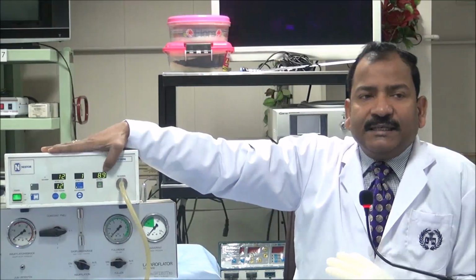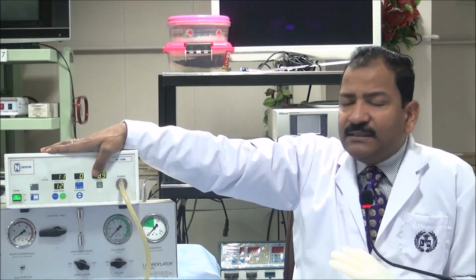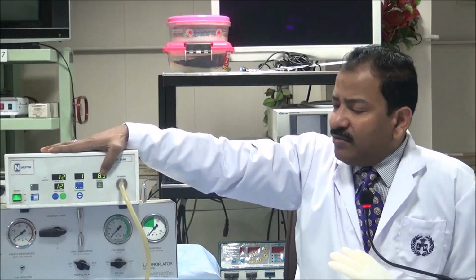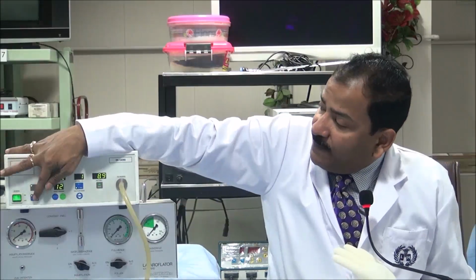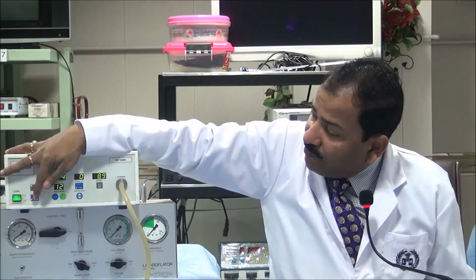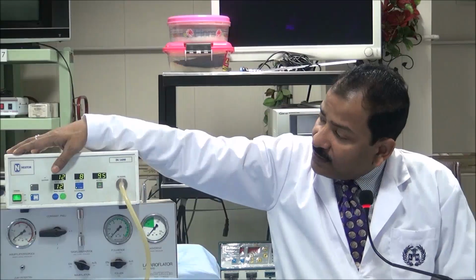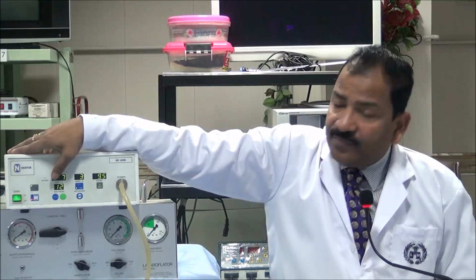Now the next indicator. The next indicator is the total amount of gas used. Total amount of gas used to reach the preset pressure. Total amount of gas used to reach the preset pressure of 12.